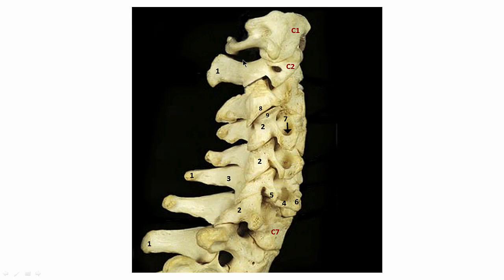C1, C2. Talked about that. That's the spinous process. Talked about that. That's the inferior articular process of C3. Okay, so if these are marked, this is a hint. This is probably what you're going to be seeing. Superior articular process of C4 would be here. Remember, the whole ball of wax here is the articular pillar. So these articular pillars are important. That's what transmits axial load. There's another one, articular pillar.